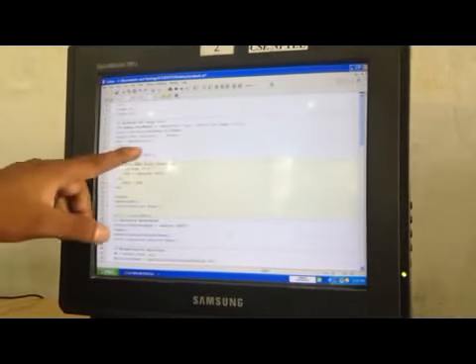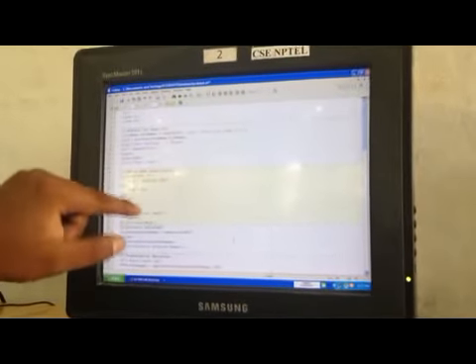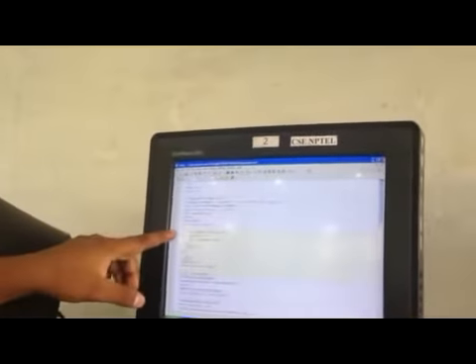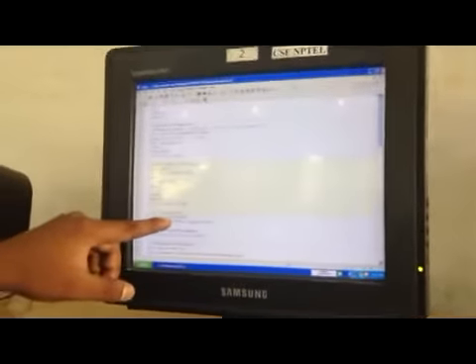Firstly, we are considering the dimensions of an image. Normally, RGB images have 3 dimensions, that is red, green, and blue. The syntax gray equal to rgb2gray is used to convert the RGB image into the gray image. And then the syntax else gray equal to RGB image: if the input image itself is a grayscale image, then it is considered as the input image, and the image will be displayed as a grayscale image.